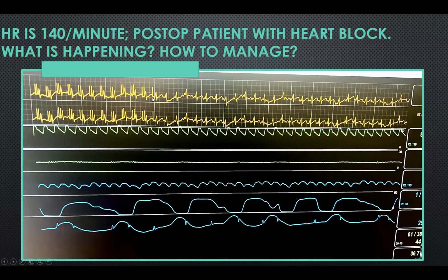It's just that the device sometimes has more difficulty sensing the high frequency pacing spikes. So here it's able to see it and it's augmenting it. And here, for whatever reason, it's not. Maybe the patient rolled a little to their left or right, or one of the stickers was less adherent to the skin, but for whatever reason, it didn't see them. And so it stopped essentially amplifying the pacing spikes. And there was concern at the bedside that there was a problem with the pacemaker, but there was not.